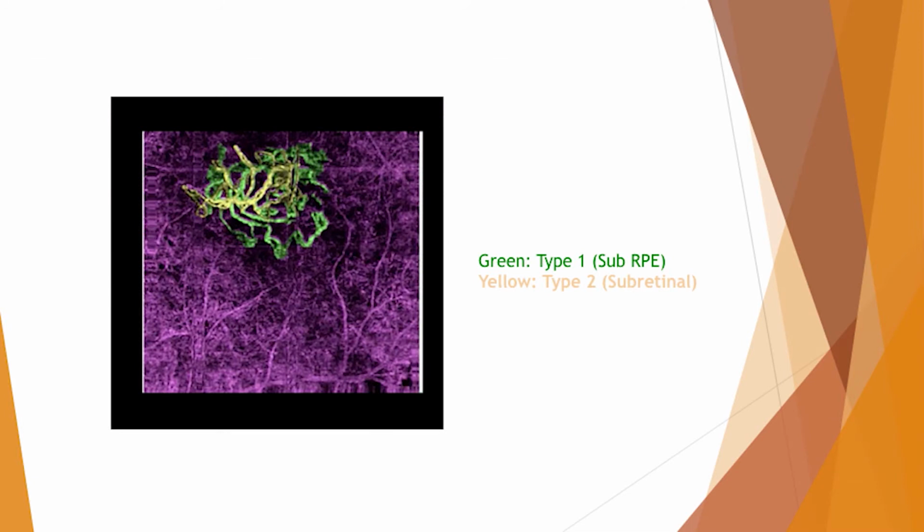This is what it would look like in color. If you recall the last piece, the piece that remained at the end was that yellow piece. That was my classic, and the green was the occult, the one that was underneath it.